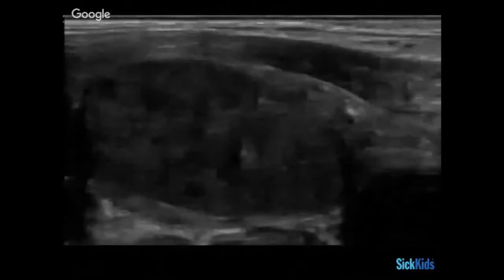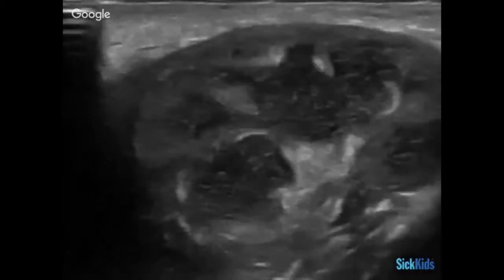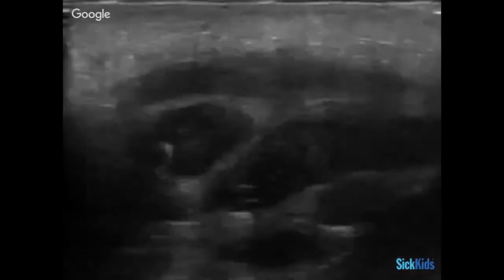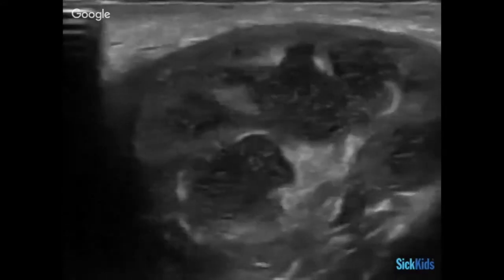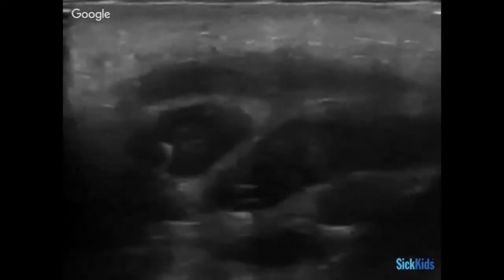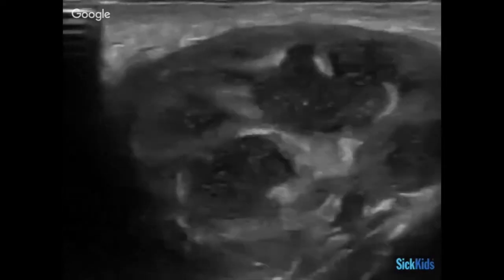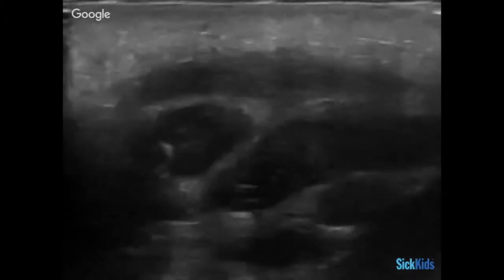Little follicles, so maybe more lymphadenitis. Yeah, I agree. What about this one? That's good. Malignancy versus necrosis. Right. But in the context of the case stem that I gave you, so that's small growth, more likely to be abscess until we prove otherwise, right, with a failure to treatment.